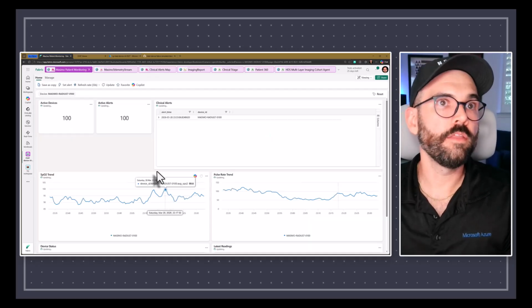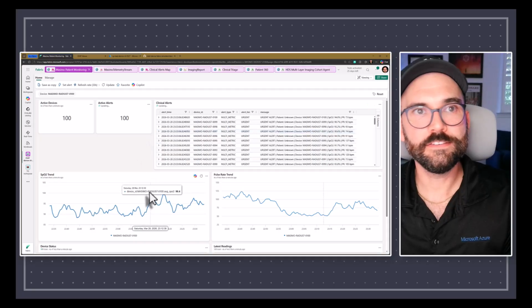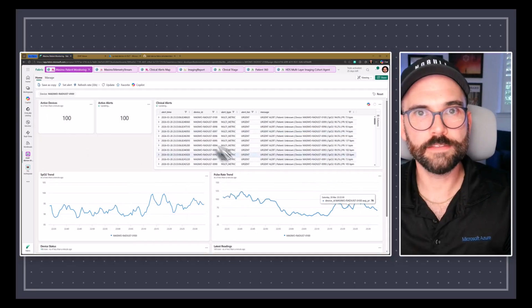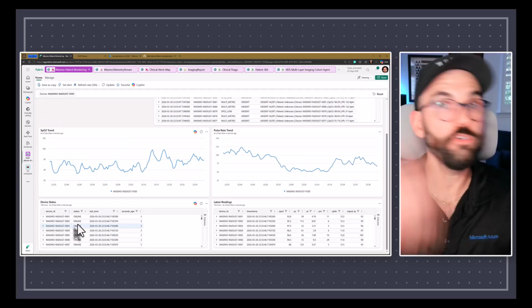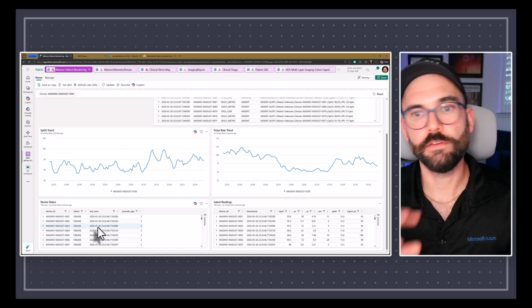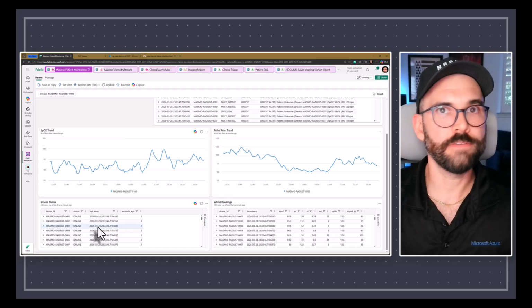And then on the patient monitoring, and this updates every 30 seconds, I can see, based on a singular device, some trends and things like that, but also all critical alerts coming in, and if my devices that are supposed to be monitoring things are in fact online. So I could have another alert, or maybe a Teams message fire, if any of this stuff happens. Pretty cool.